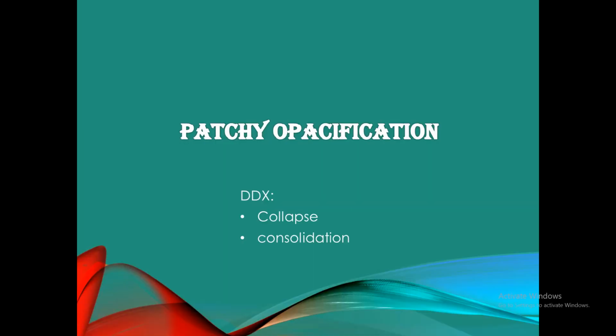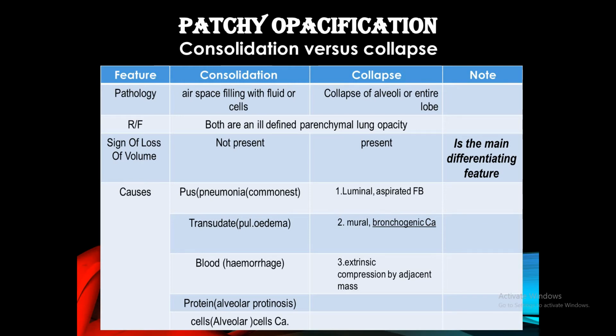Patch opacification. Patch opacification, as we said, is an ill-defined opacity of any size. We have 2 differential diagnoses, collapse and consolidation. This table is showing the main difference between the two. Consolidation is an air space filling with a fluid or cells.